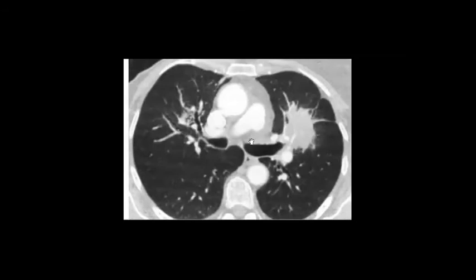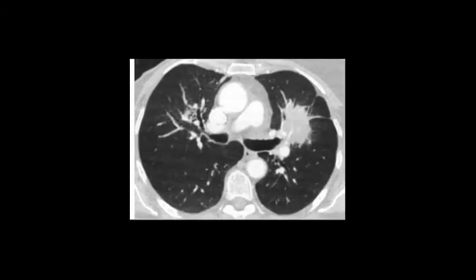So you'll check for lymphadenopathy, any collapse or any effusion. This is important for your description to not lose any marks. In this case, it's a very easy case.